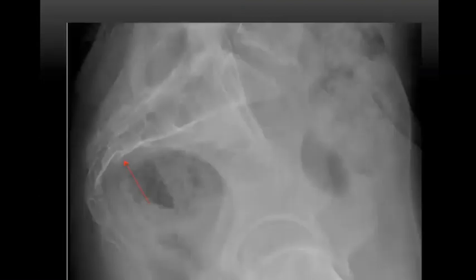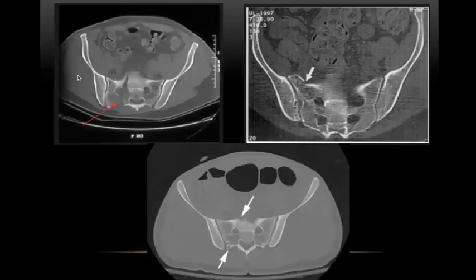All right. So this is on lateral radiograph. You can see the fracture here. So this is actually S4. On CT, these are the fractures. Fracture through the sacral here and onto the inferior aspect of the sacral bone, and this one crosses into the sacral foramina. Right, that's it for today.